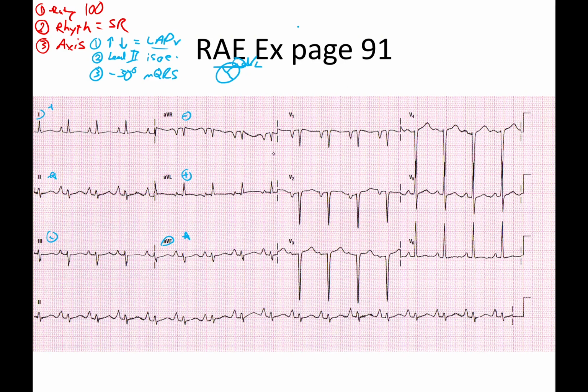the next step is number 4, which is, I'm just going to go ahead and say, do we have Wolff-Parkinson-White, any deltas? And if we look, nope, we've got pretty sharp QRSs throughout. Our PRIs look awesome. So I'm going to go ahead and say no on that. Nope.